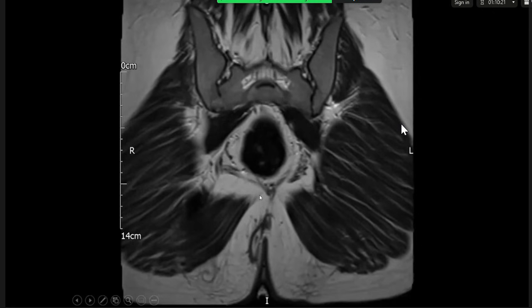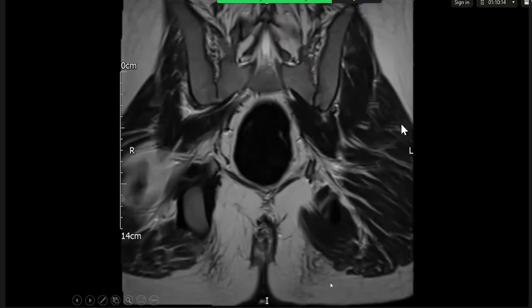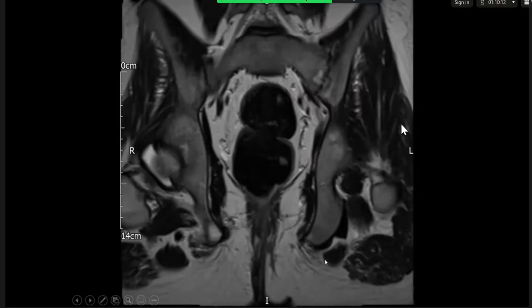I can't scroll anymore. You cannot? Sure? Yeah, now I can. Okay. Yeah. So go to the next sequence, please.